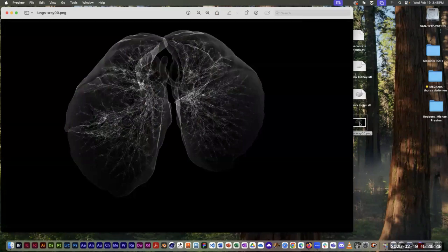So these are not meant to be real fancy renders. These are just to show me that you experimented with the different region of interest and segmentation options in Horos. So you've got a little over an hour to play with these. Actually do one.